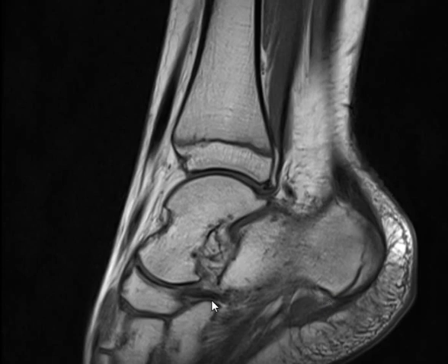What's the defined severe? So there is no sign of avascular necrosis here, and it's not the location.